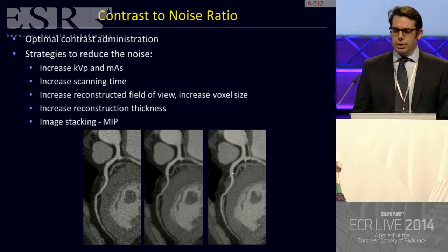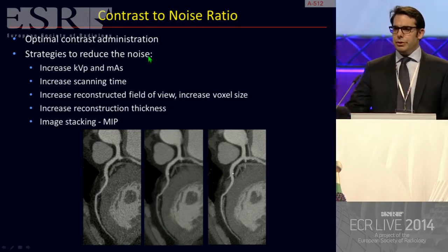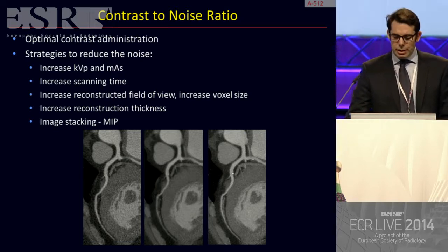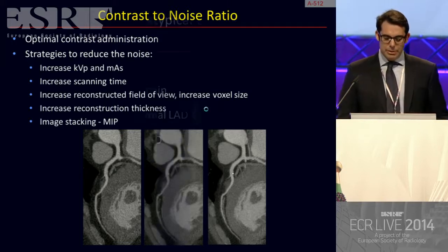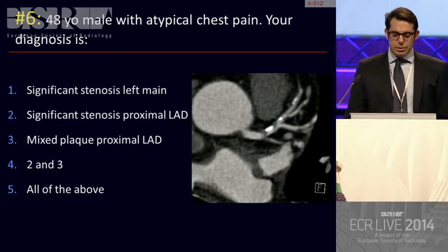So always be careful with the noise and the contrast. If you are using low kV, you will get more signal, but you will get more noise. Remember that you can use different strategies to decrease the noise. Remember that, please. I will show you another typical case that happened to me.